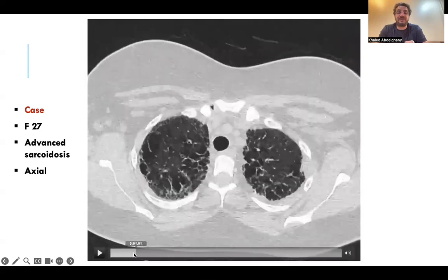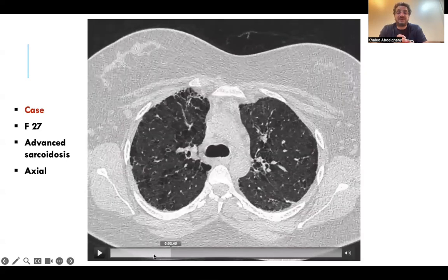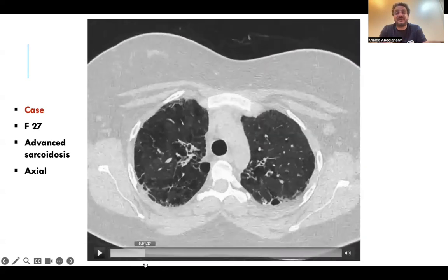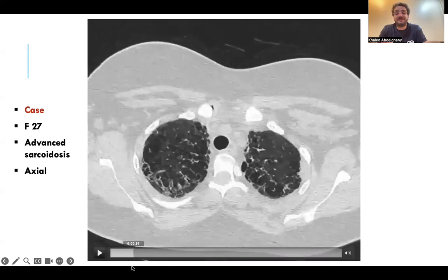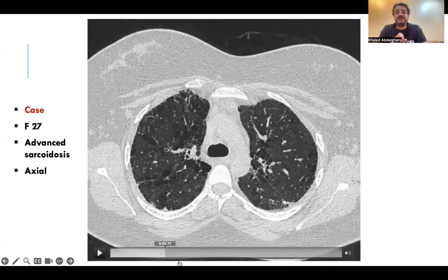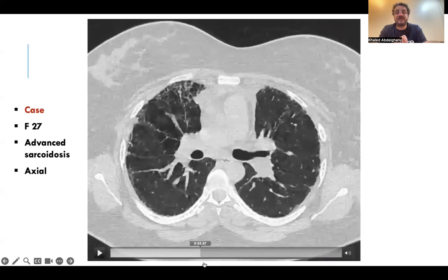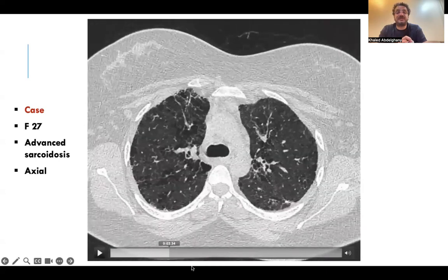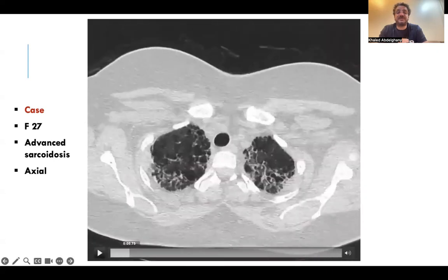And the problem here is that you can misdiagnose or misinterpret the emphysema as combined pulmonary fibrosis and emphysema syndrome, which is not the case, because again, the emphysema in CPFE is smoking-related centrilobular emphysema and paraseptal emphysema. Here we have paracicatricial emphysema.